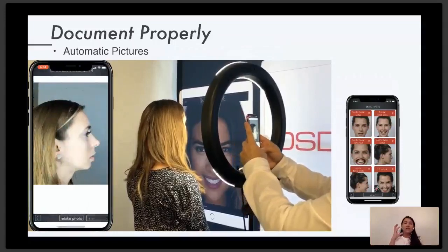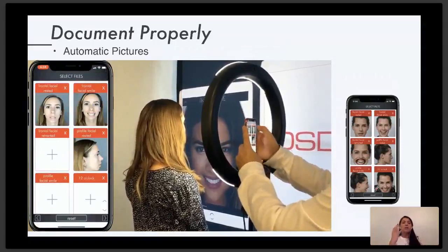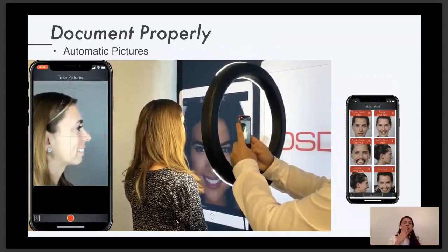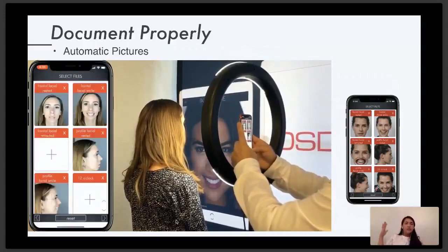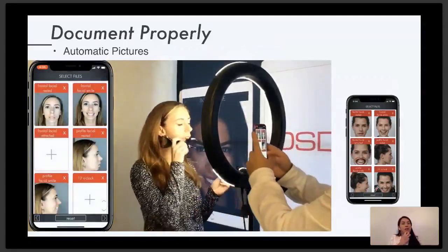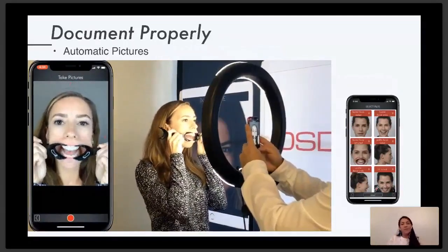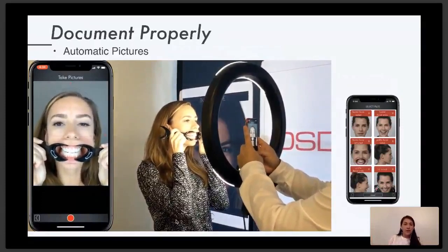So that is it. We want to take it this way because we want to center our profile picture towards the face, okay, towards the mouth, to see the details. If you position the camera lens too far behind, all of the details from the mouth and the face are going to get lost, and we are going to see only the cheek and the ear. So we want to position the lens as anterior as possible.